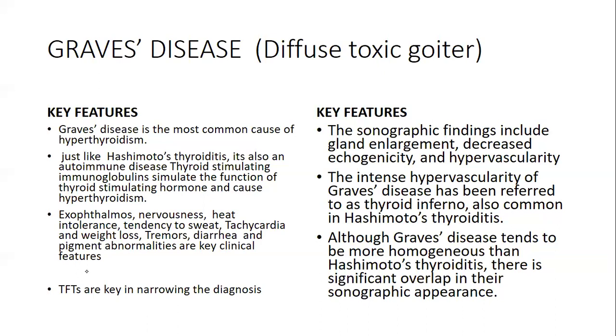But with Graves' disease, the parenchyma is usually homogeneous, though there is thyromegaly, conferring a thyroid inferno on color Doppler interrogation, just like we have with Hashimoto's thyroiditis.